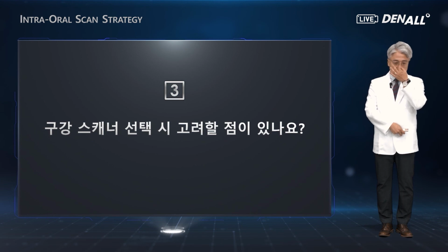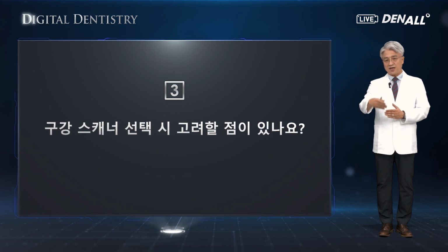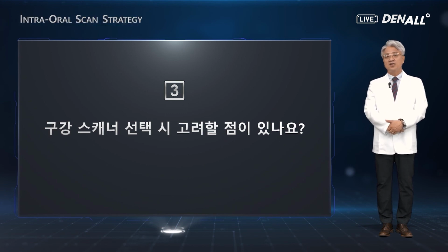In applying the scanner clinically, the tip size is important. If the scanner tip size is very large, it is difficult to scan in the posterior region or adjacent contact region between teeth. Therefore, it is better to have a small scan tip size.